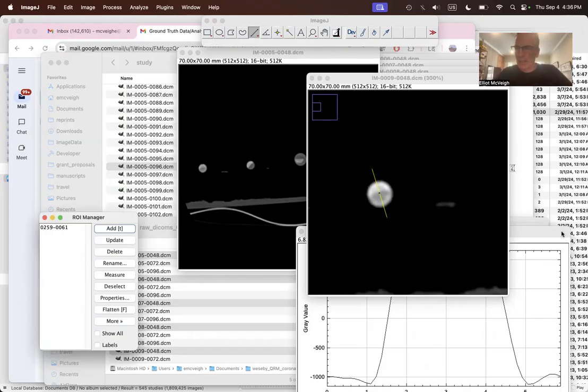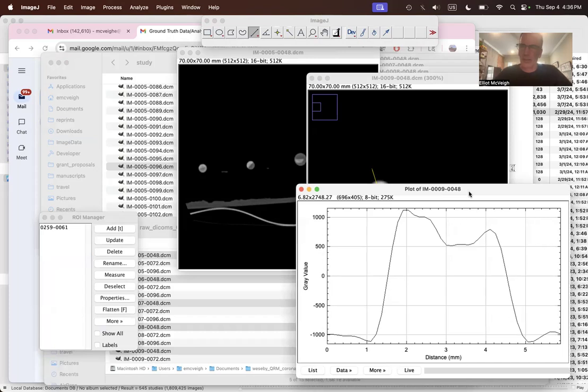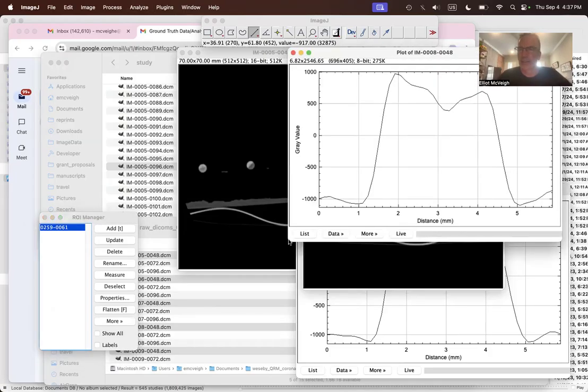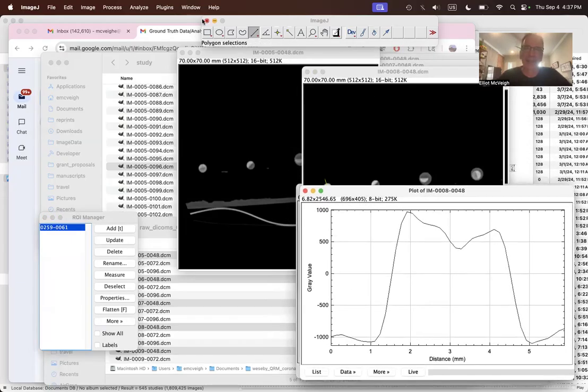Okay, and I have made this graph at that energy level. So let's go down to a different energy level. You can go to the window, you can select, we did 09, we'll select 08 here. And I think if I just click on this profile, it repeats that profile right here. And I can then say Command K and get a new plot. And that's the plot of that one. I can just build them up this way.